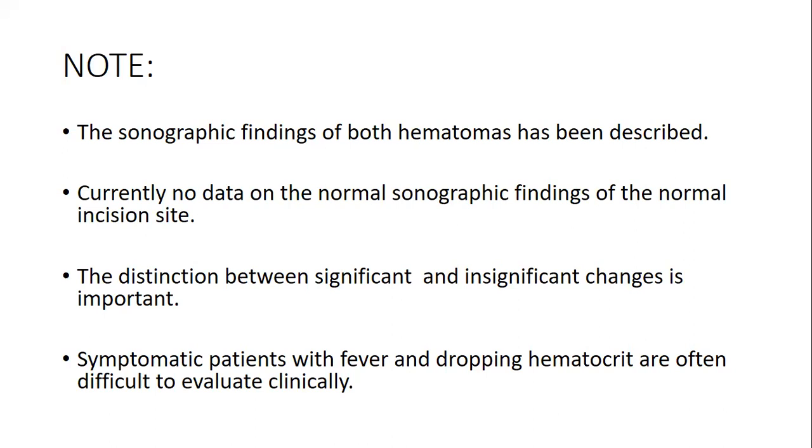Because of those sutures, we may find certain appearances on ultrasound, and we may think there's a hematoma, but it's very important to distinguish between the normal changes of the post-cesarean uterine incision site and those that are significant hematomas. Sometimes the clotting mechanism around the incision site may not be adequate, so you tend to have small hematomas which may be insignificant, at different levels and sizes, but hematomas may also be larger and significant.